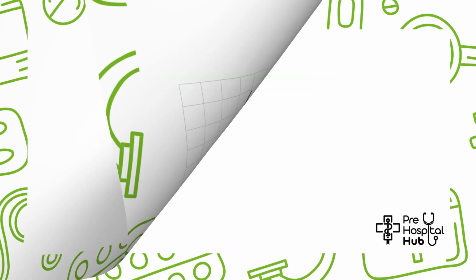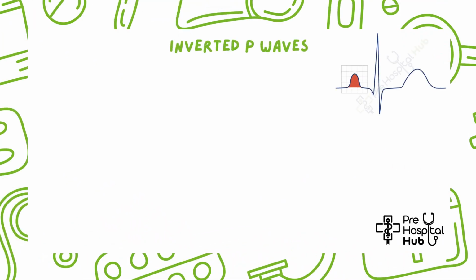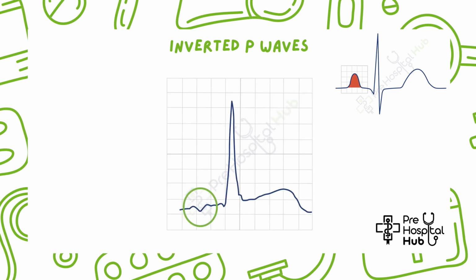Another P wave morphology may be inverted P waves. Looking at inferior leads, inverted P waves can indicate a non-sinus origin of the P wave. Another video that covers PR intervals is on our YouTube channel, but if the PR interval is greater than 120 milliseconds, then the origin is within the atria. If the PR interval is less than 120 milliseconds, the origin is from the junction.